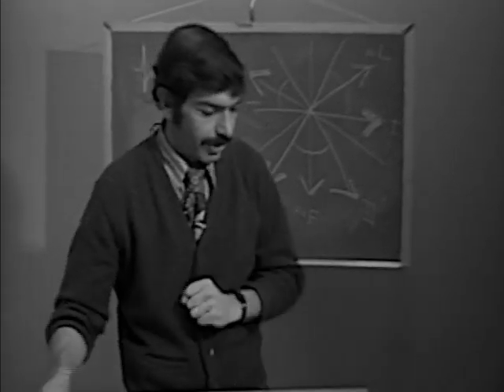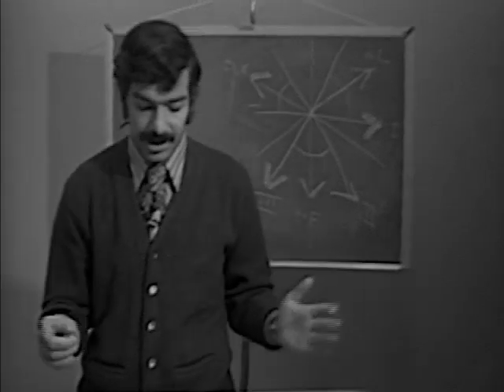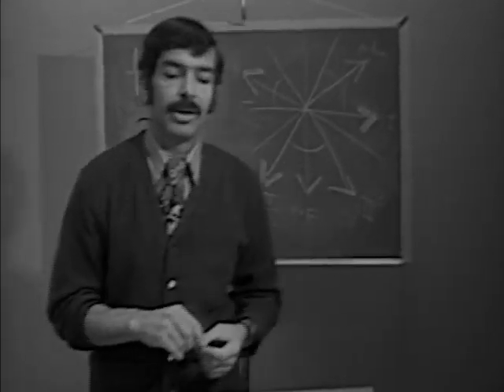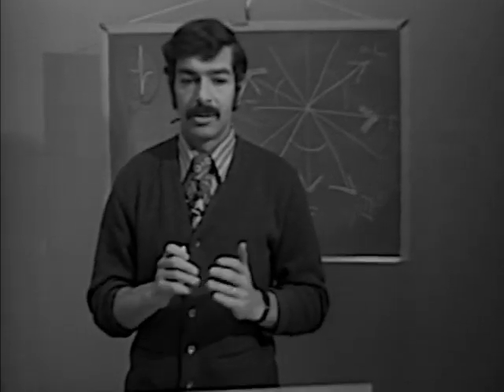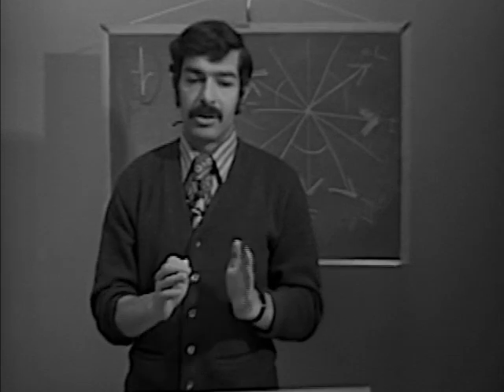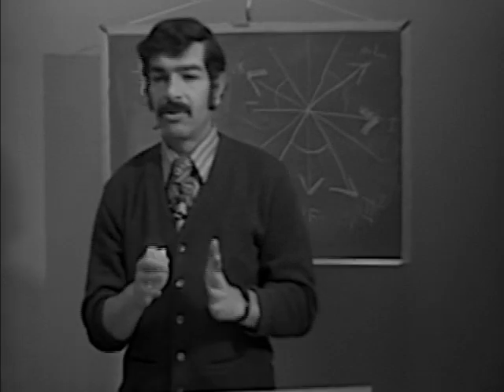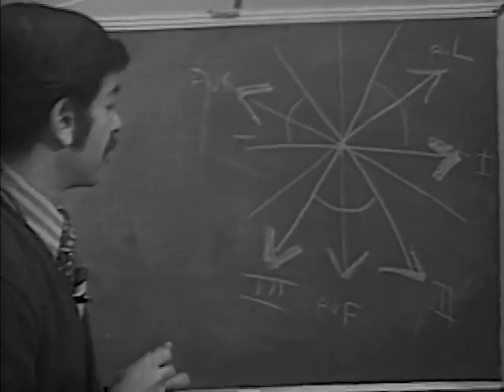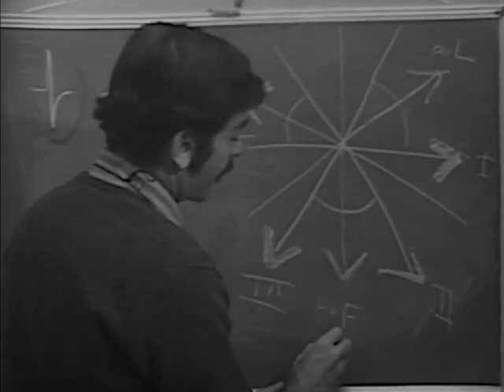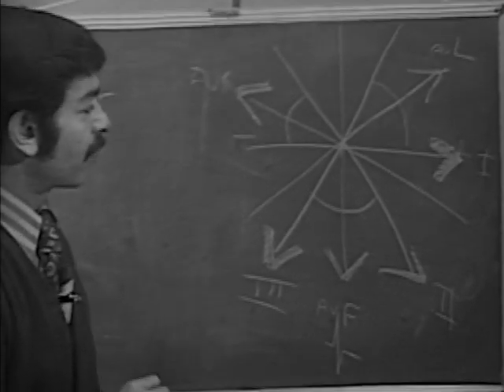Okay, let's just say, for example, that it's lead AVF. We look at an electrocardiogram, and we see AVF is isoelectric. Now what we want to find out is what the mean axis is doing. The point is that the mean axis runs directly at right angles to the isoelectric lead. So we took our example, we said it's isoelectric in AVF. Now we said our mean axis runs directly at right angles.